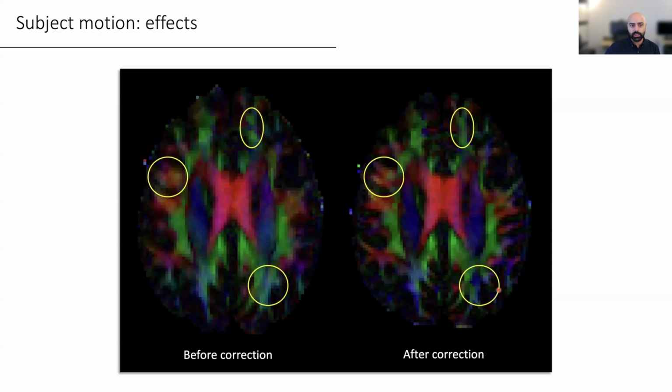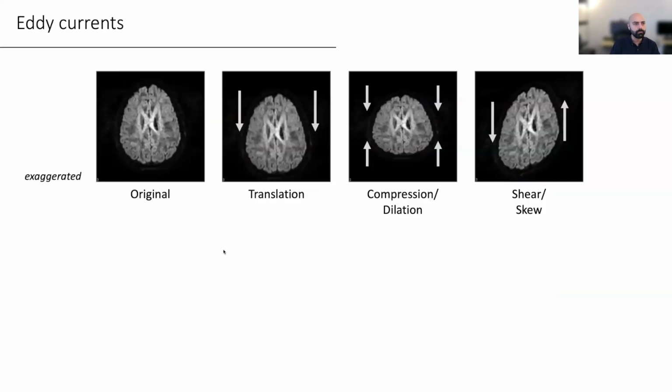And similarly, we can look in the back, where this primarily green blob indicates that the primary direction we recovered here is fibers oriented in the anterior-posterior axis. Well, there's a whole gap there of fibers pointing in the superior-inferior direction that we missed without the correction. So even if just on average the data seems okay, motion correction, even without these massive differences, is still important because the subtle effects will affect everything you do, including connectivity-derived analyses.